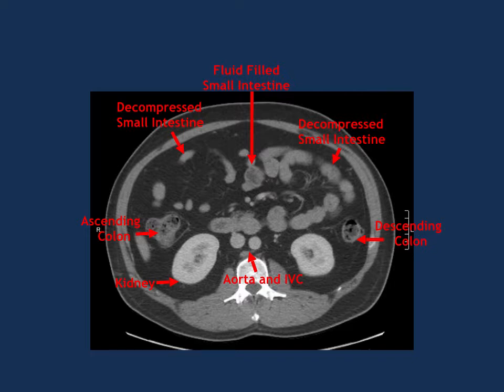And if you measured the Hounsfield units, which you can do on your own time. Now you're getting technical. Yeah, but it's good to know the Hounsfield units. If you measure the Hounsfield units in the middle, it'd be much less than on the bowel wall. Okay, great.